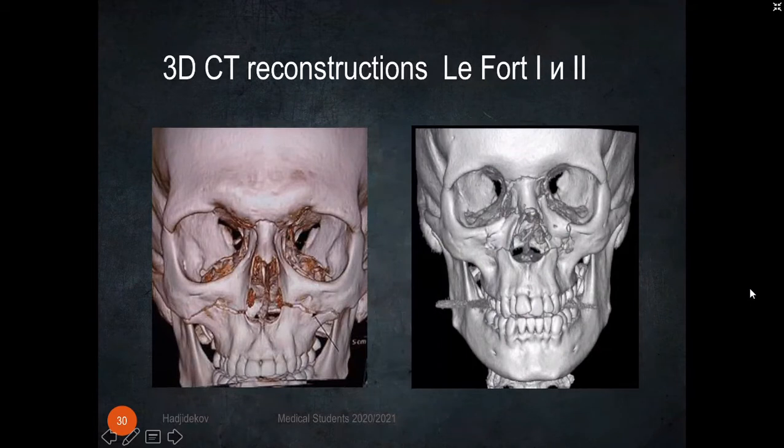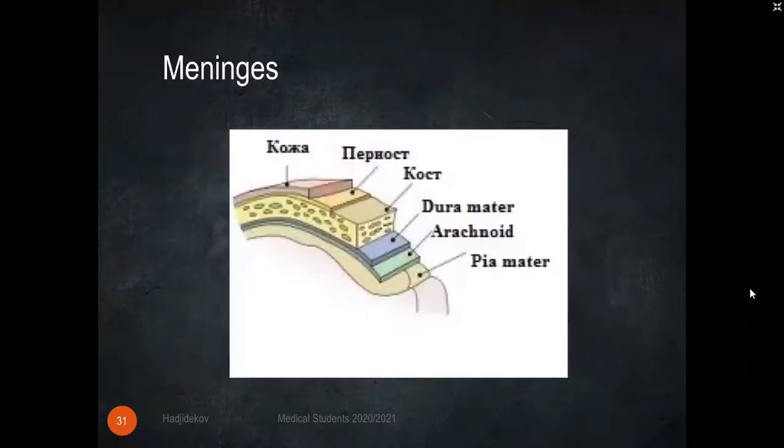And here is another, more complicated Le Fort 2 fracture. Sorry about right and left side here. For me, the bigger skull is the first, Le Fort 1, and the smaller image of the skull, which is not so zoomed or magnified, is Le Fort 2, because you see in Le Fort 2 the lower part of the left orbita, but also the lower part of the right orbita, a fracture. On the left side, this fracture is a little bit displaced, so it needs to be operated.